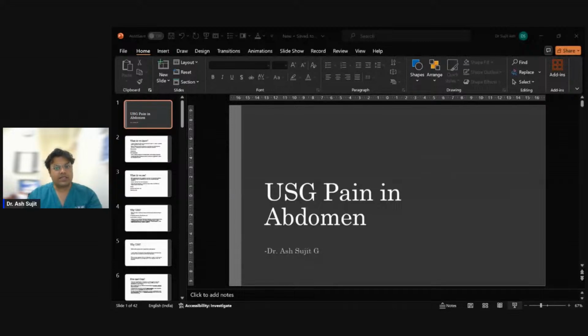We all know, as we study OBGY, that these follicles are dependent on FSH and LH, which will help them grow in the proliferative phase of the menstrual cycle. And one of the follicles will become the dominant follicle, which will grow up to the size of 2.5 to 3 centimeters. This will rupture and lead to ovulation. I guess everyone is clear about this much. So if you see this sonography, the arrow indicates the cumulus oophorus. That is where the growing dominant follicle will give way and give rise to the ovum.